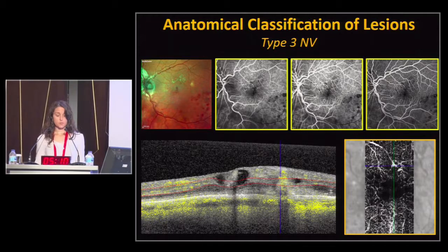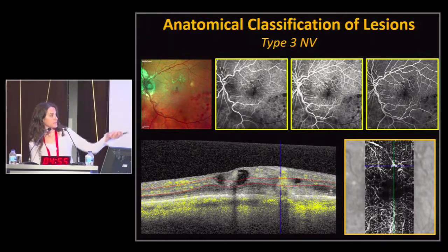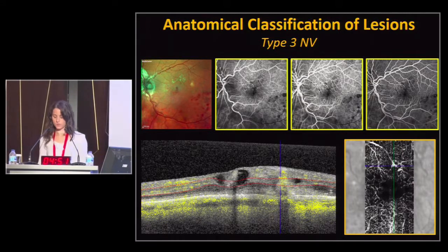And it's important to point out that with OCTA, it's not that useful to use the en face viewing, but the B scans, and really go through all the B scans and look for these kinds of lesions with this column of flow signal.